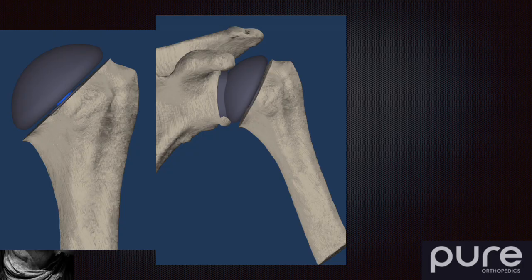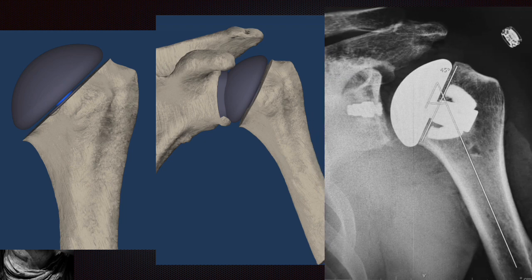So the fun thing is we send the images, again, before surgery. We tell them, this is what your x-ray is going to look like. And then this is what it is. And we can measure it out. We wanted that angle to be 45 degrees. And when we measure it with our other templating software, it actually is perfectly 45 degrees.